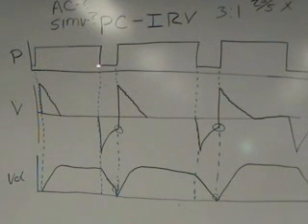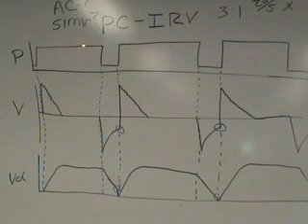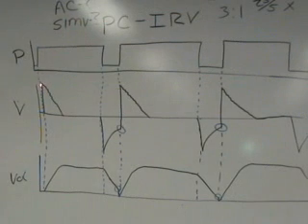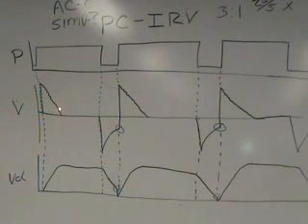You see that I have a time trigger, and a time trigger. My I time is set because in pressure control I always set an I time. And if I look at my flow rate, it decelerates just like it always does with a pressure control setting. It zeros, it stays at zero until that I time is done, and then my patient exhales.